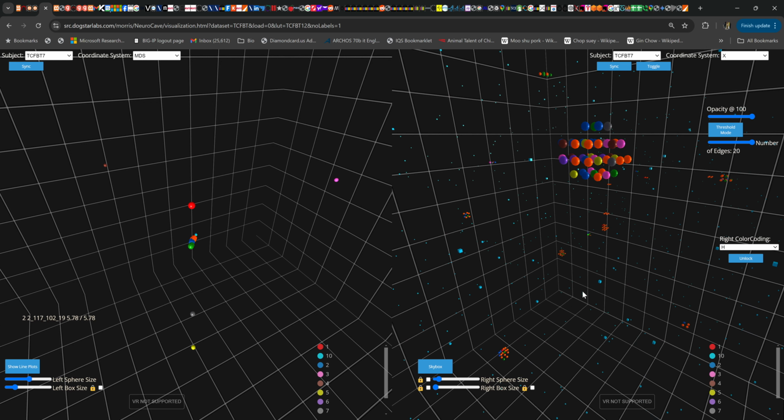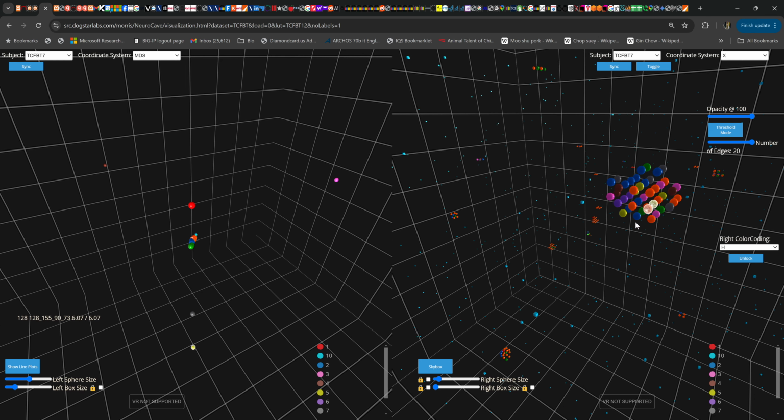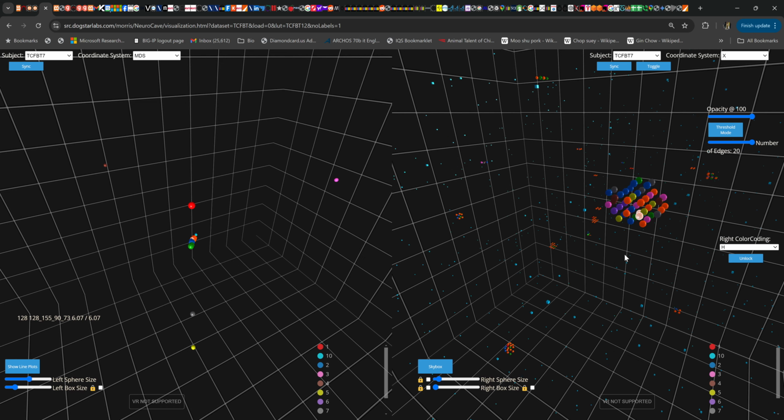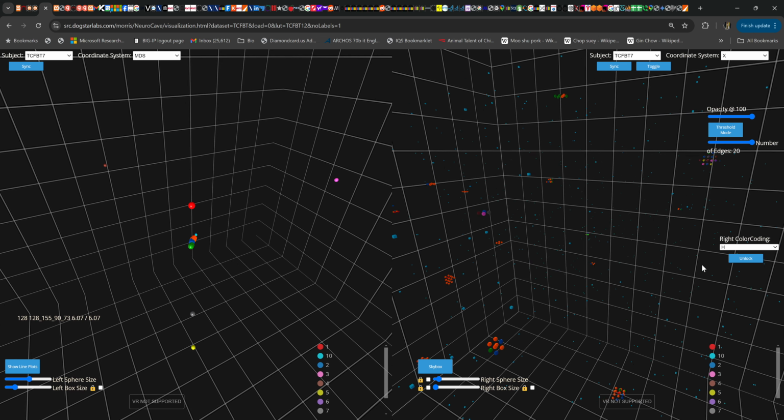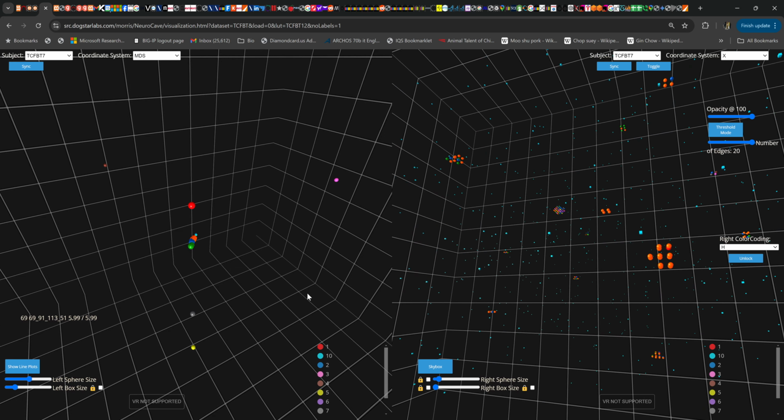You can see the clustering membership of the various tumor regions and compare them to their MDS coordinates on the left.